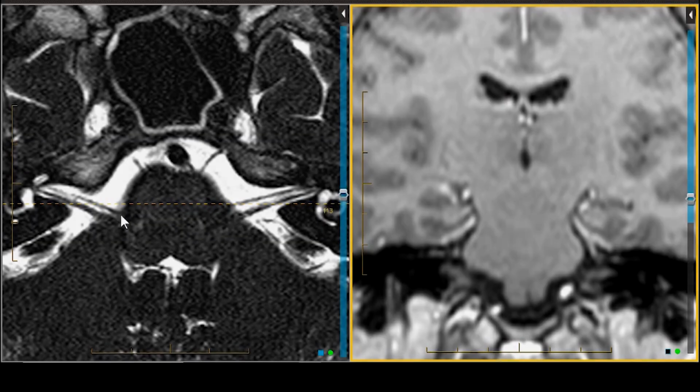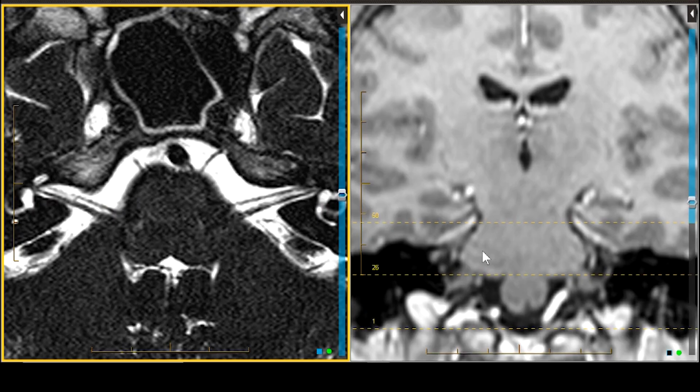Now let's talk about the apparent origin of the seventh and eighth nerve complex, or cranial nerve 8, which goes into the lowermost portion of the brainstem pons at an oblique orientation. Now this is a little bit poorly understood or not well recognized, that it's the lowermost aspect of the pons that the 7th and 8th nerve complex comes off, almost to the level of the medulla. If we cross-reference the cochlear nerve right there, look where it is, right close to the pontomedullary sulcus.